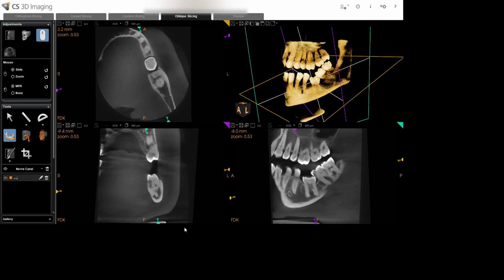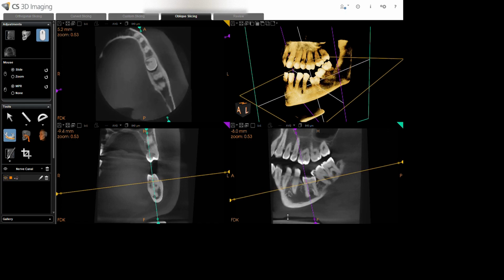So basically it is a case of cervical external resorption, and the entry point is a focal entry point, not a large one, along the lingual surface at the lingual cemento-enamel junction, and from here starts your resorption. So you can see how extensive the root resorption is, that is extensive cervical external root resorption in this case.